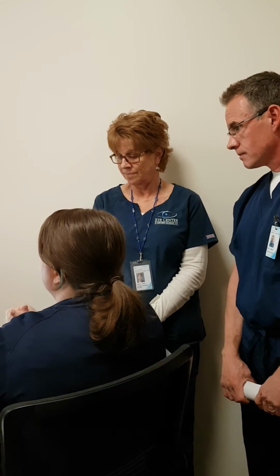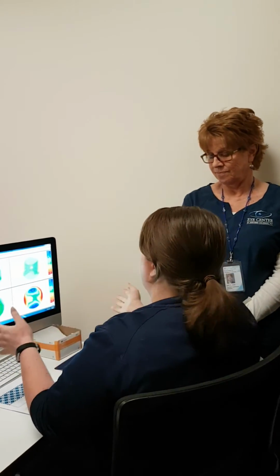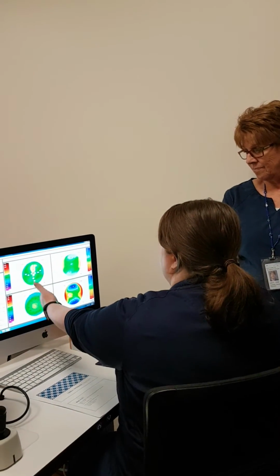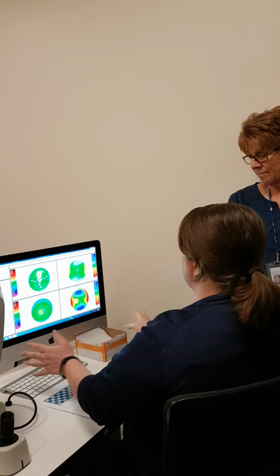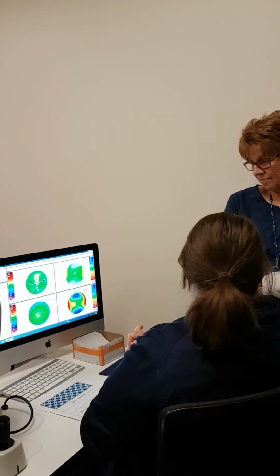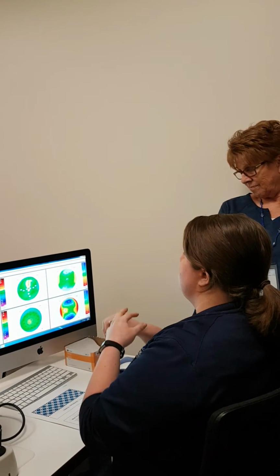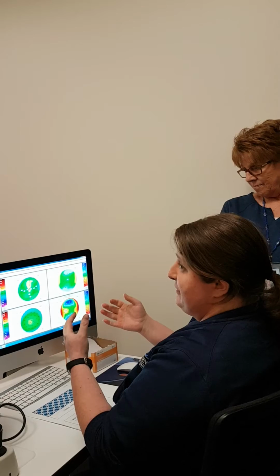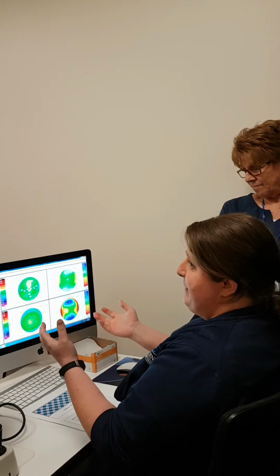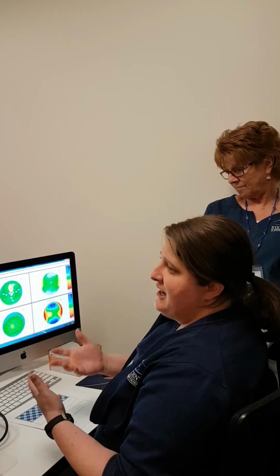If you can look at the cornea and go, yep, that looks pretty regular, there's no issues with thinning here, it's all nice and green, I can go, they're not going to want a Belin for this patient. But if there are weird things on the floor map, send a Belin. They're going to love that, because they'll have more information to talk to the patient.